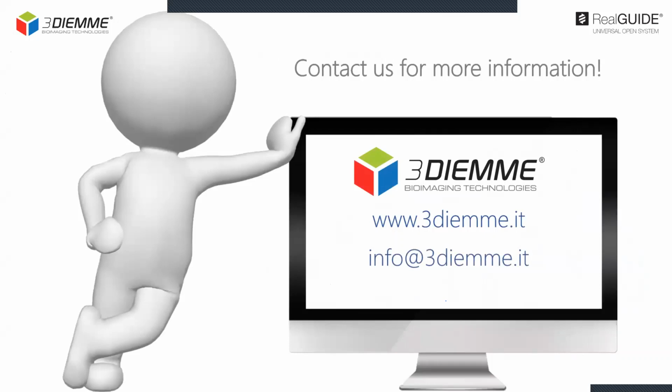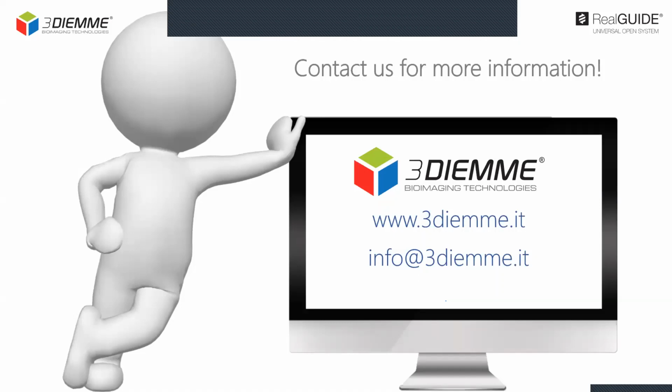And I pass the word on to my colleague, engineer Alice Sormani, who will show you our complete RealGUIDE digital workflow, starting from data import up to the creation of the surgical guide.